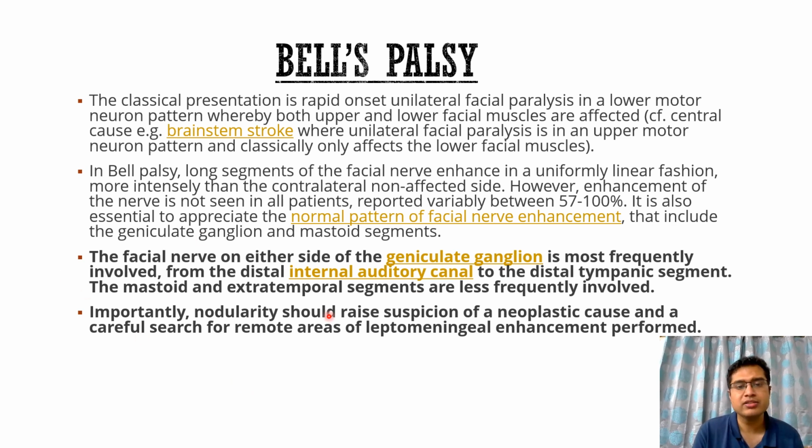The mastoid and the extratemporal segments are less frequently involved, and importantly the nodularity should raise the suspicion of a neoplastic cause, and a careful search for remote areas of leptomeningeal enhancement is performed in such cases. Look for any tumor. So this is also an interesting case where a CISS or Fiesta sequence is a very important sequence. It helps us to diagnose a case of Bell's palsy and also any associated tumor.